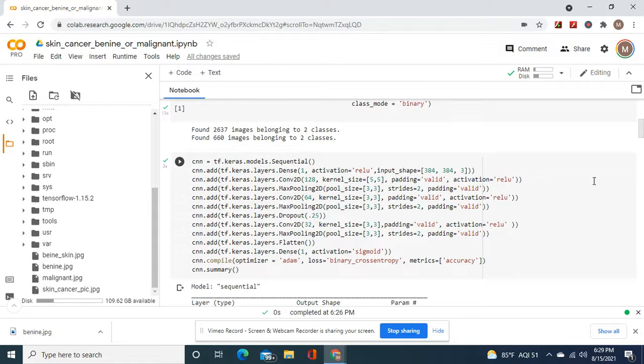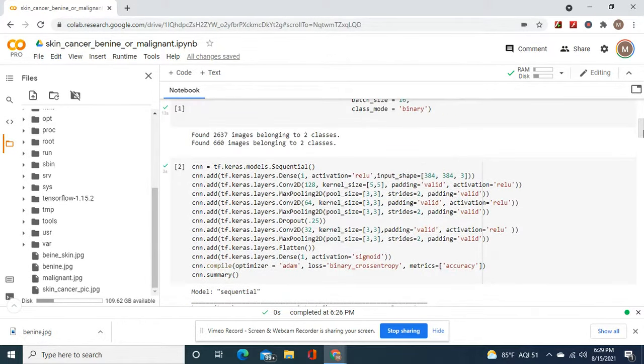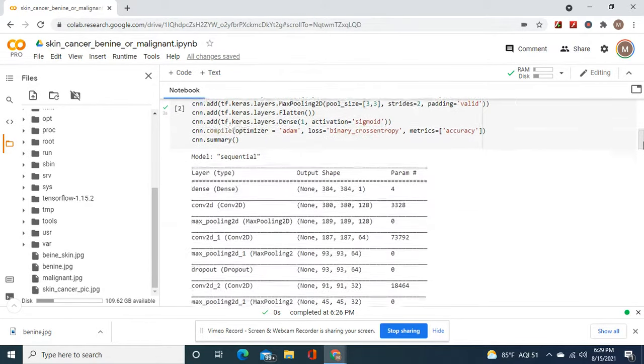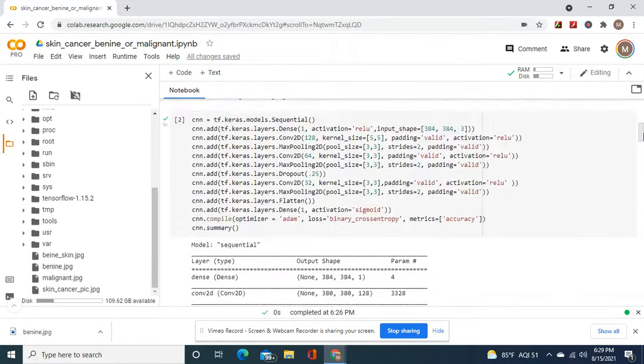I did the same I did for the Python, just because the Python or Anaconda worked. I had a feeling it would, without needing to change any of these pool size or kernel size, or do a different shape with the convolutions. This is the shape I like to keep with a lot of the pictures. Then I only need to add dropouts whenever it stops learning.